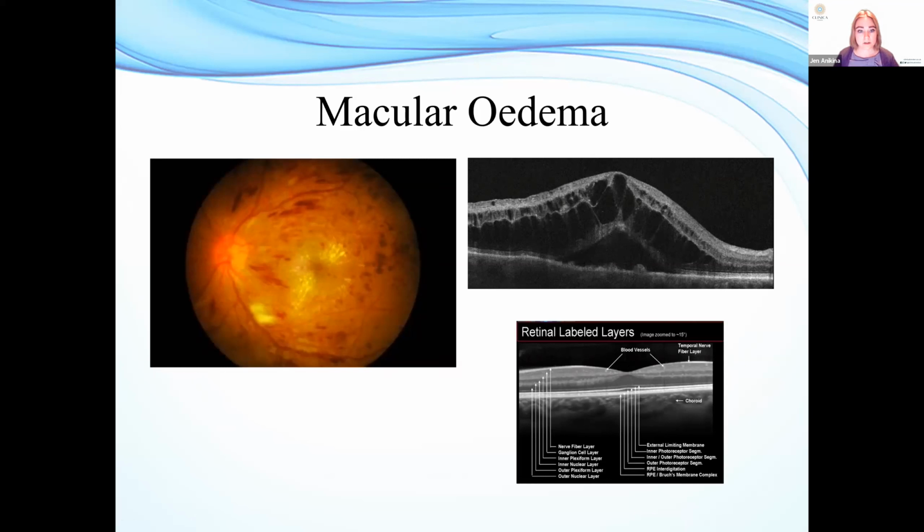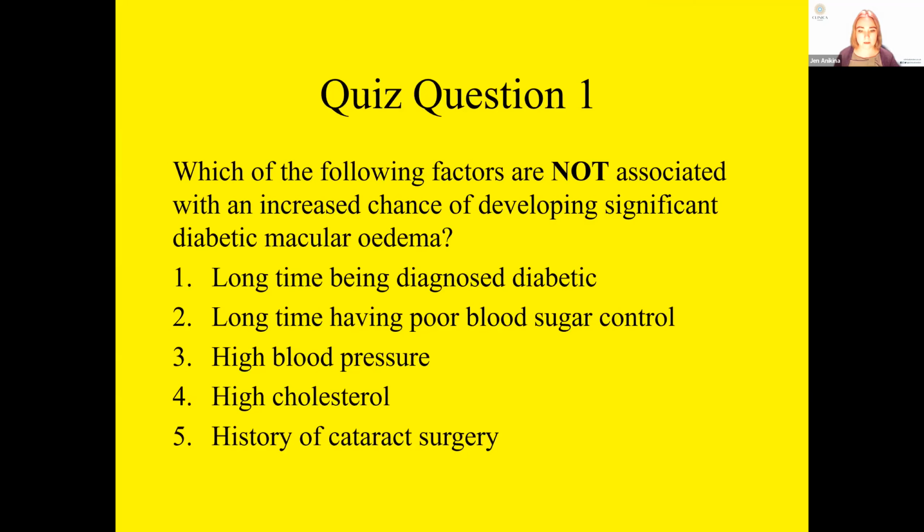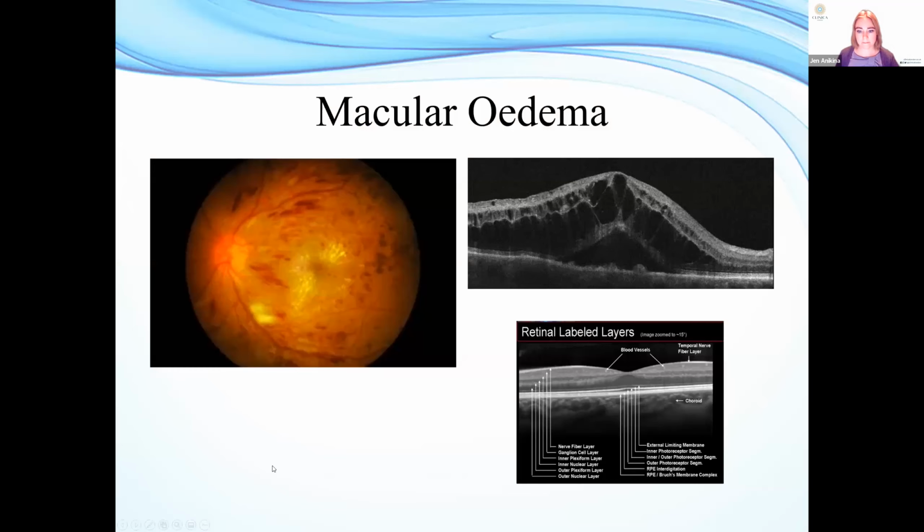Now, how urgently would you want to deal with this? If you had a patient walk in with this to your practice, how urgently would you want to refer? Well, this is probably only an orange, because by the time this has happened, you've got a little bit of time where it's not going to change much.